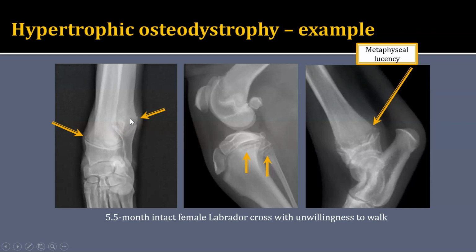here in the distal ulna with a little bit of soft tissue swelling, not very much metaphyseal sclerosis. In the patient proximal tibia here, there's also this radiolucent zone adjacent to the physis within the metaphysis, even in this proximal fibula. So again, it's going to be important for you to remember what the actual physis looks like so that you can see this adjacent radiolucent zone. And then here's the distal tibia of this patient where there is a fainter radiolucent zone and associated soft tissue swelling. So this patient is early enough that we don't have the metaphyseal sclerosis and there is no metaphyseal cuffing.